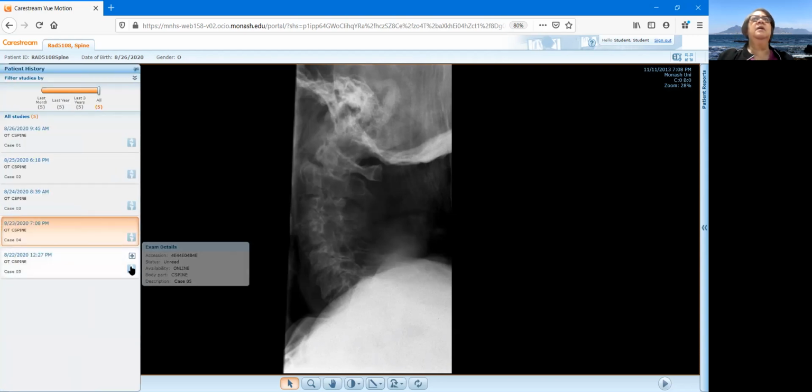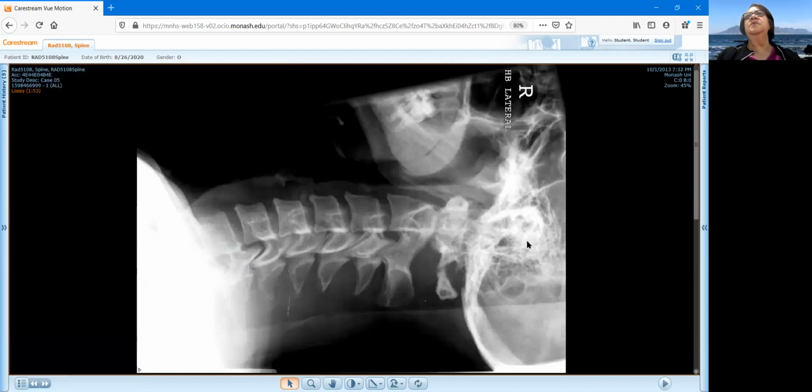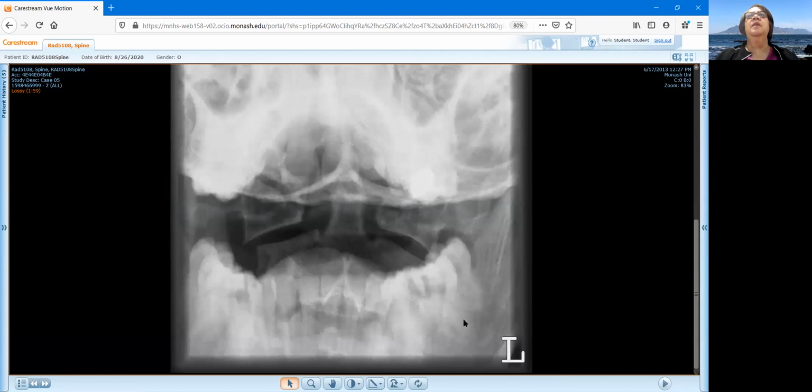And in the final case, the patient's head was forced against the windscreen and has a very tender neck. I want to start with the open mouth view. On this image, if you look at the distance from the lateral part of the dens to the lateral mass, there's a big discrepancy from right to left. We can see a much more widened space there.